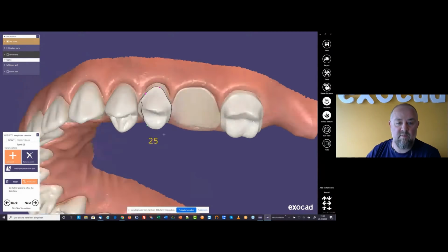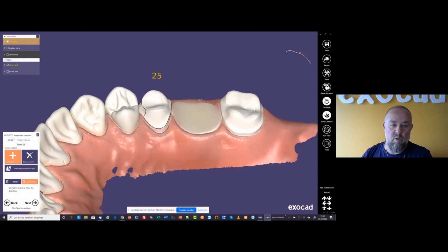Normally, in 95% of the cases, the algorithm works perfectly. You have to know with an intraoral scan, it's maybe quite difficult. If you have a prepared or ditched model, then of course the algorithms work much better. It's quite easier for them to detect the margin line.